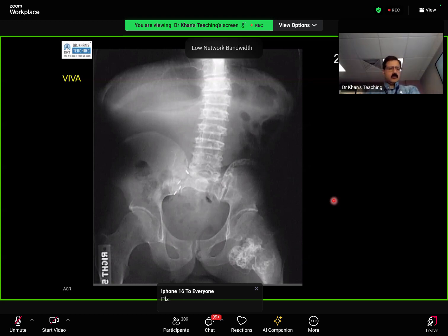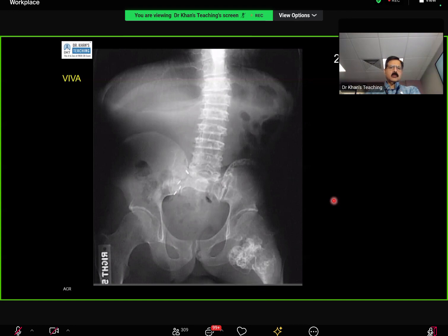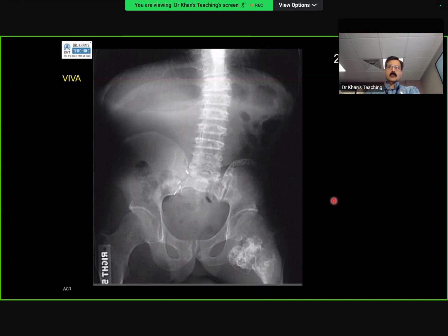Okay, I have been presented with a frontal abdominal and pelvic radiograph of a 20-year-old male patient. I can see that there are multiple surgical clips on the right side of the pelvis. Other than that, in comparison between the sacroiliac joints, I can see changes of sacroiliitis on the right side, and the sacroiliac joint is normal on the left side.